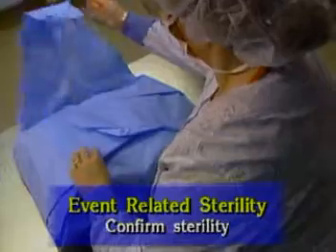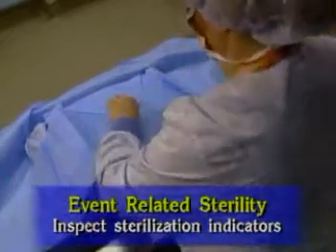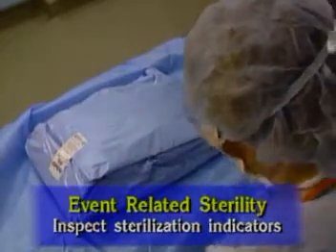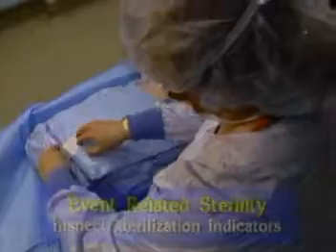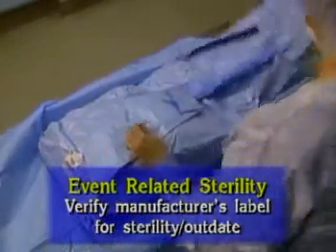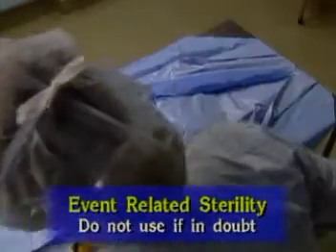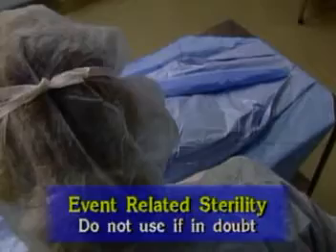Confirm that an item's sterility has not been compromised by handling. Inspect the indicators on the outside of the package to make sure of the proper sterilization process. If indicated, verify the manufacturer's label for sterility and outdate, and do not use the item if sterility is in doubt.